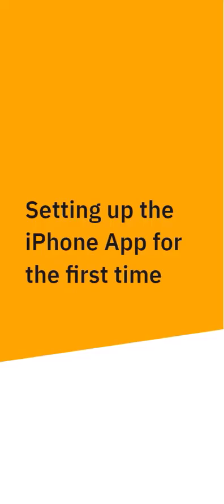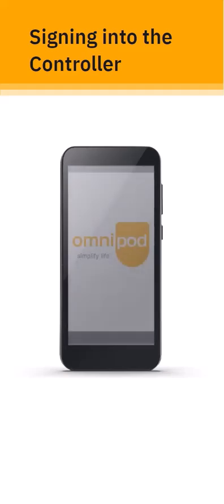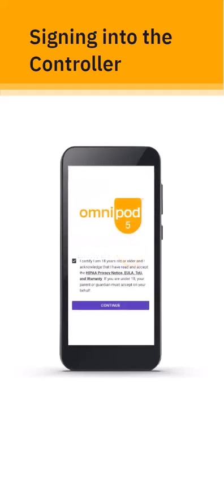Let's go over how to set up the Omnipod 5 iPhone app. First, turn on the provided controller by holding down the controller's power button that's located on the right side of the device. Then, follow the on-screen instructions to log in.